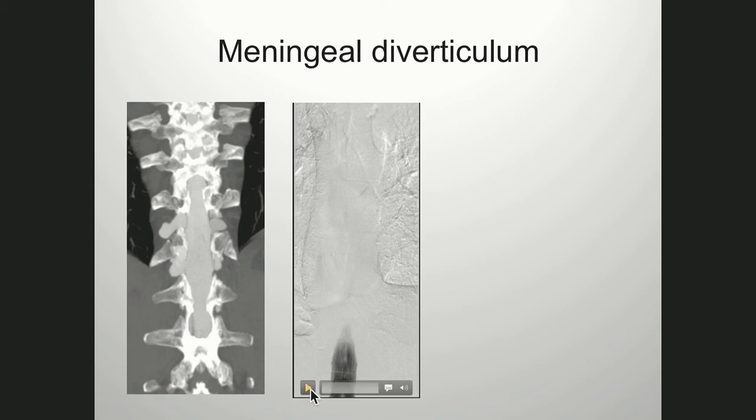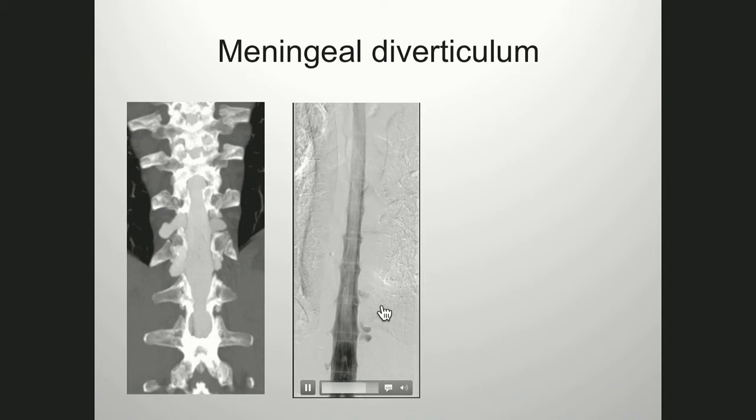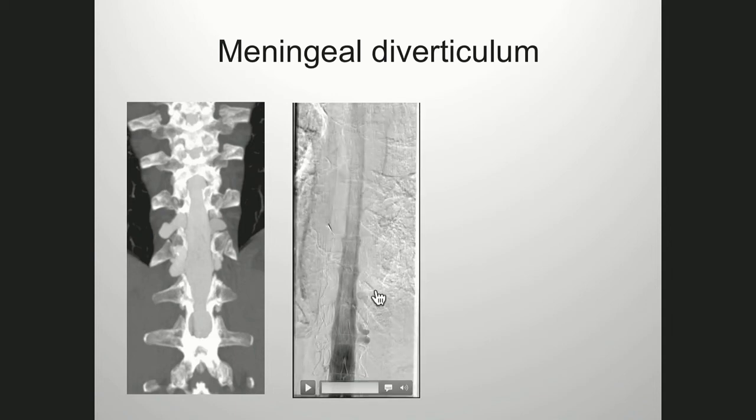So we ended up doing the DSM to give us an idea whether there was an earlier opacification of any of those. And based on the DSM, we decided that the TL junction was the responsible one, not the cervicothoracic junction, and she was successfully operated with good results.